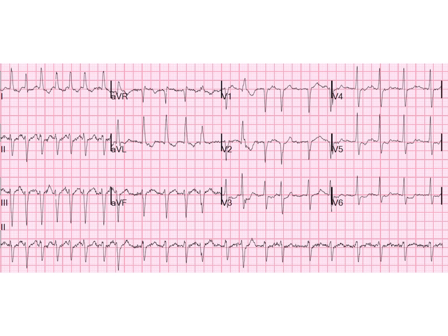This is a very, very high yield ECG, and it may not be obvious at first, but I want you to pause the video and look around and see if you can tell me what we are looking at on this ECG. This is atrial fibrillation, and almost equally as high yield as STEMI, if not more. So AFib is very, very high yield because it's so easy to recognize. You don't see P waves, and it's irregularly irregular, right?